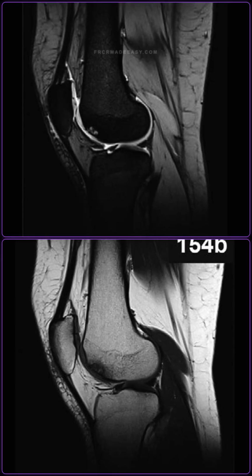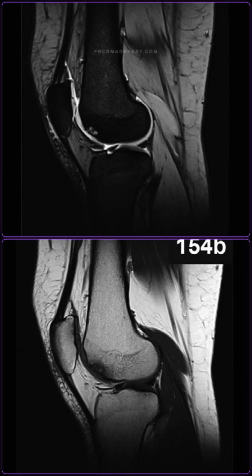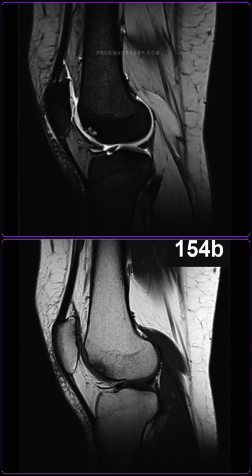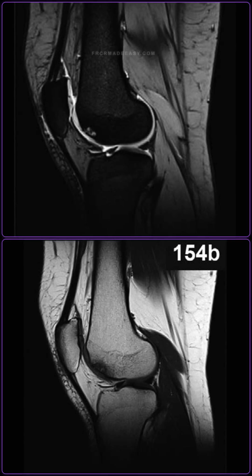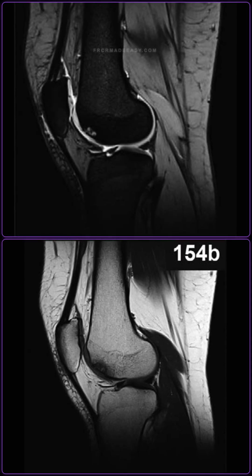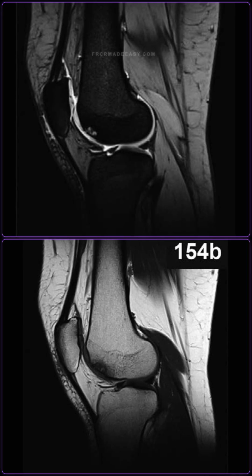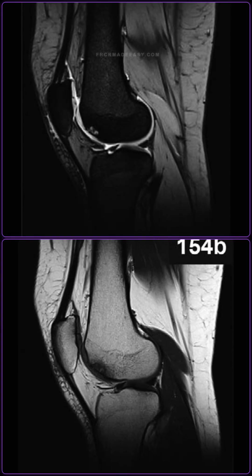As a radiologist, I would recommend comparing these findings with prior radiographs to check for interval displacement or joint effusion. I would recommend a dedicated non-contrast MRI of the knee to definitively evaluate the cartilage integrity and determine the stability of the osteochondral fragment. I would also suggest checking for any intra-articular loose bodies that could cause joint locking.